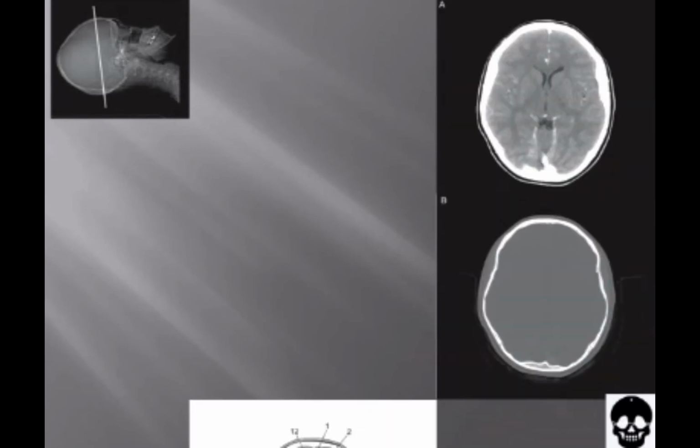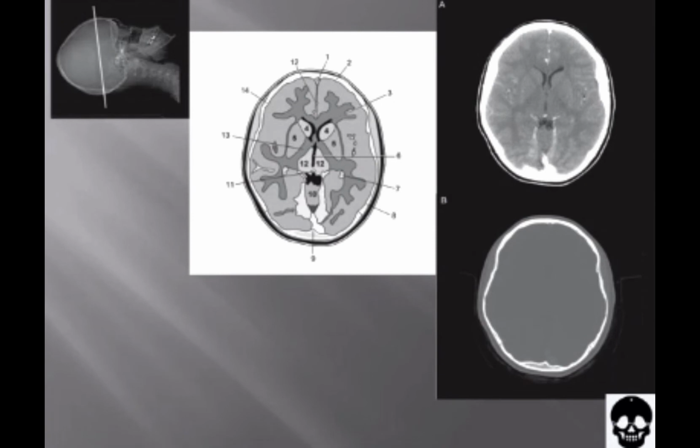A radiology technologist practicing in any field of radiology must understand basic human anatomy and physiology in order to perform his or her duties. Those working in CT must also be able to identify normal anatomic structures on cross-sectional cranial images. This is the fifth image.